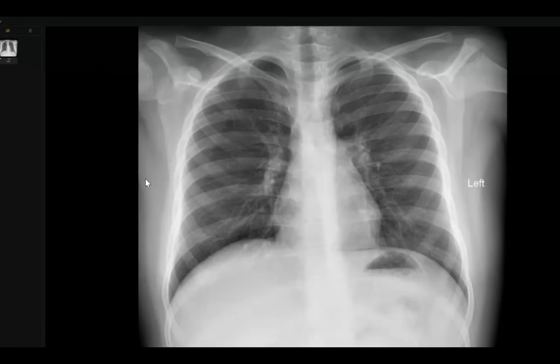However, the stomach outline is normally visualized. One second. We mentioned that the patient is a traumatic patient, so no need to talk about the foreign body. Correct? Okay. What else? What will you do next? Sir, I would do an ultrasound. Candidate in the hot seat, please.